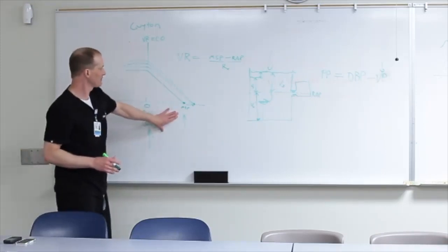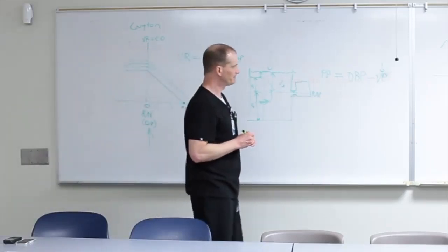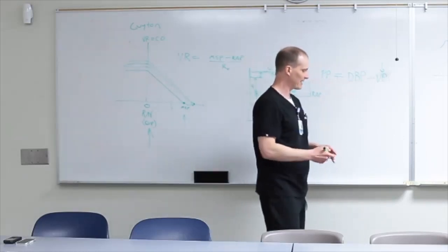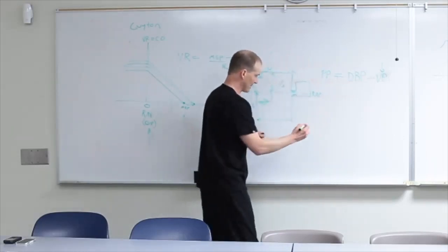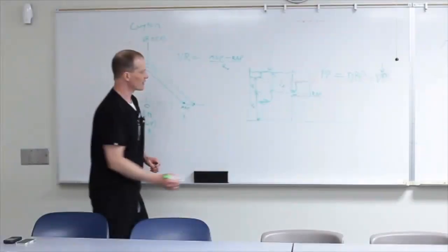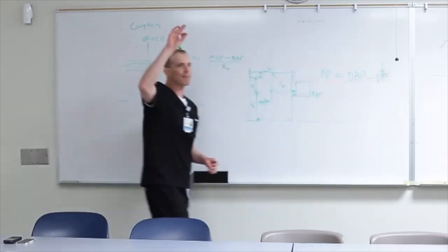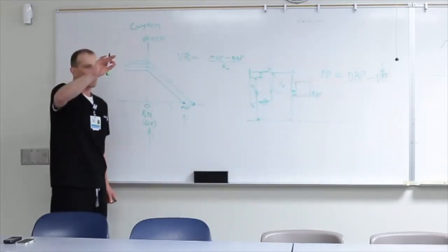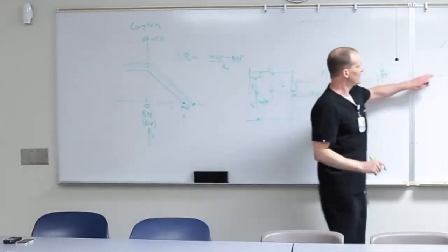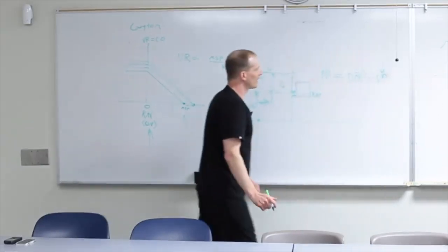So the IVC, we talked about that, and then let's talk about the theory behind what's going on with the hepatic vein and the portal vein and the intrarenal venous Doppler. Okay. So here's our baseline on our Doppler here. And let's say we drop the pulse wave Doppler right on the hepatic vein. Okay. And what we're going to see is the exact mirror image of this right here.